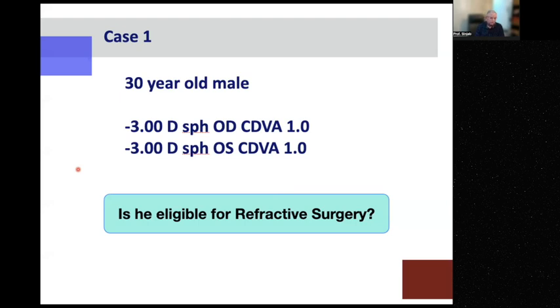Yeah, it should be less than 0.35, but up to 0.5 is okay. And by the way, the spherical aberration in the cornea is helpful for us to decide which type of lens to put inside if we are planning for monofocal. Because, you know, there are some monofocals which generate a negative spherical aberration of minus 0.27, 26 something. And some are neutral, aspheric neutral. So they generate 0. And those lenses, we put them in keratoconus because any decentration will not affect.